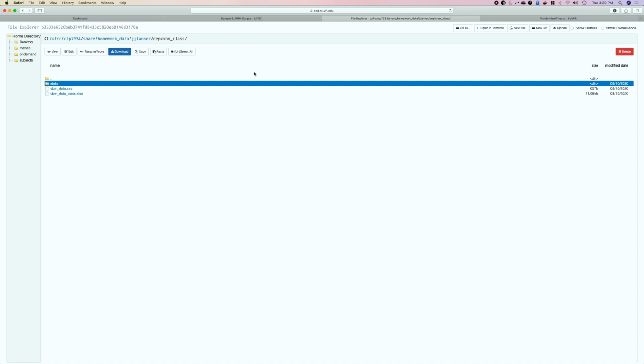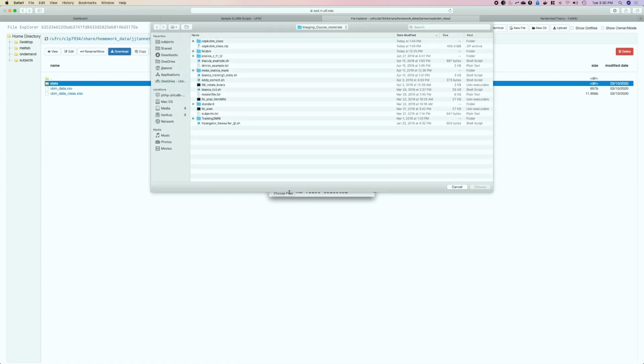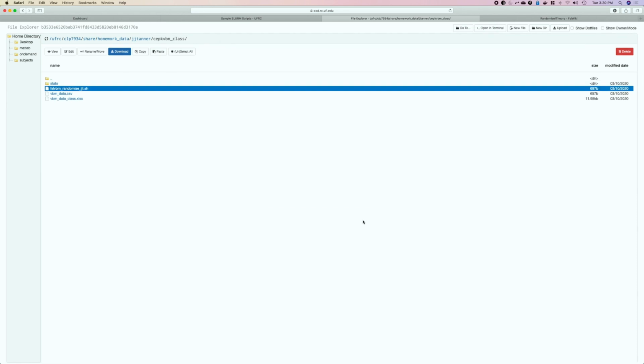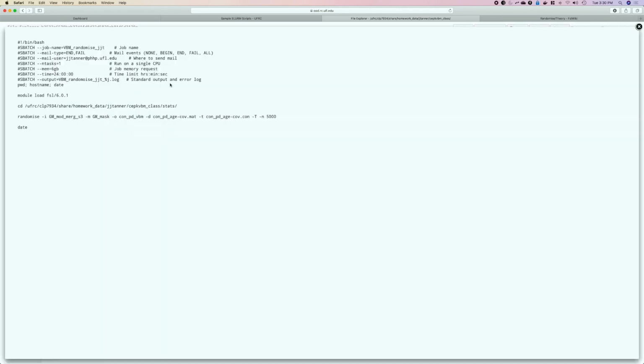However you want to organize this. Now I can upload this from where I saved it, in my case, downloads. And now I can view it just to make sure it looks good. It looks good.